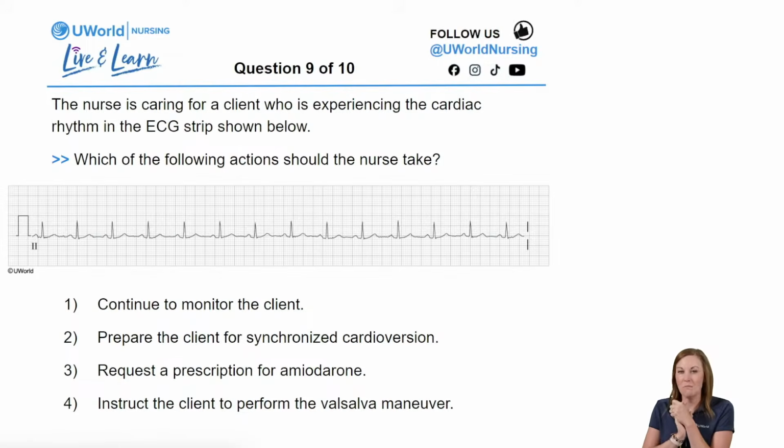Option 1, continue to monitor the client. Option 2, prepare the client for synchronized cardioversion. Option 3, request a prescription for amiodarone. Option 4, instruct the client to perform the Valsalva maneuver. All right, 30 seconds. Let us know what you think.